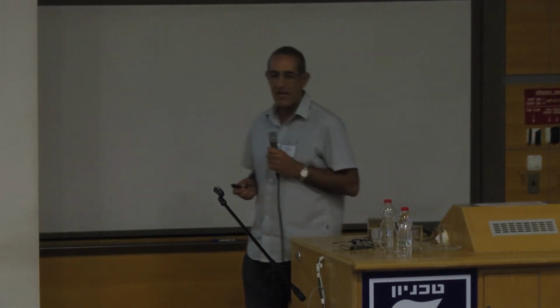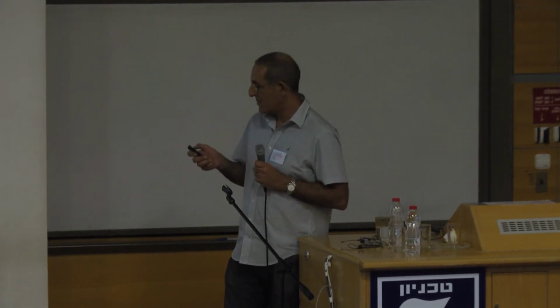So now we have a front-end chip that is doing low-rate sampling for wireless applications. So let's see what else can be done with it. And then we've given it a thought, and we said, okay, let's look into the ECG.